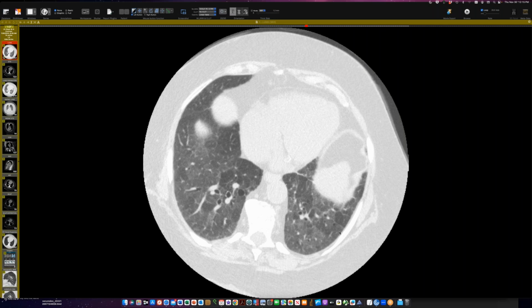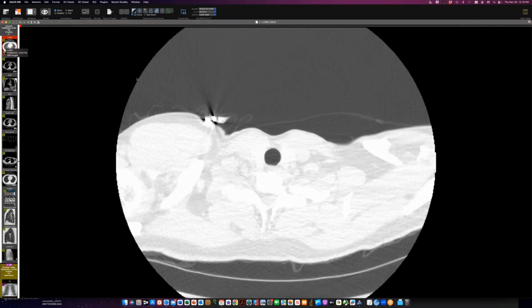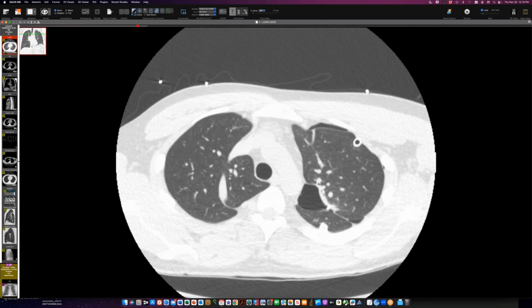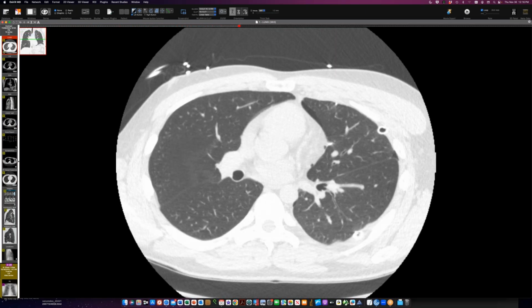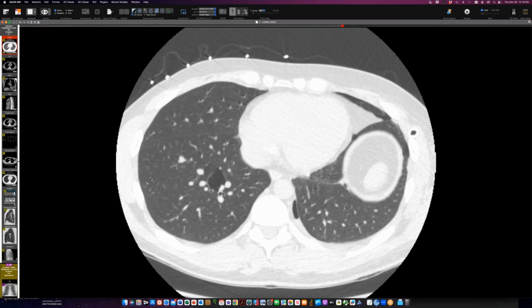Okay, let me show you another case in which the finding was cysts. Can you see a fresh radiograph? Yes. Okay, so there's a staple line up here, and this is the result of a previous pneumothorax that this person had. Let me show you CT on this person. And this is the time of that original pneumothorax that led to that stapling of a bleb in the apex. But the interesting blebs are down here in the bases.